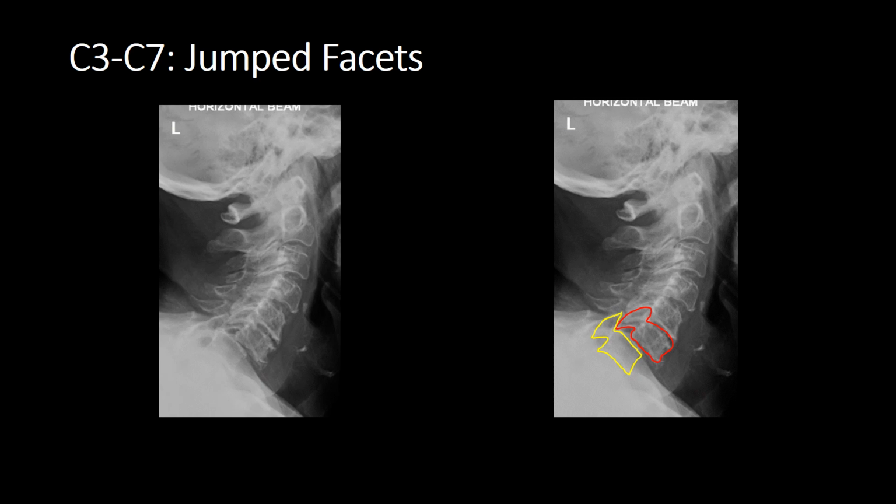C is for cartilage. Let's look at intervertebral disc space. It's squishy, but if you look here, we can see spondylotic changes. We've got moderate spondylotic changes, reduction in intervertebral disc space, anterior osteophytes, and increased sclerosis of the vertebral end plate. So this is degenerative. This is normal. This squish of the intervertebral disc space is abnormal. This is not normal. So we have compression to the intervertebral disc space.